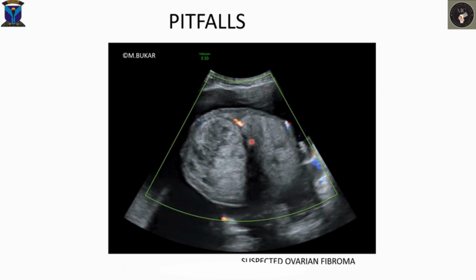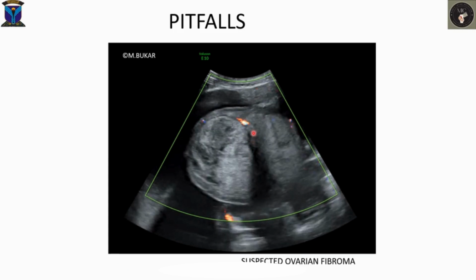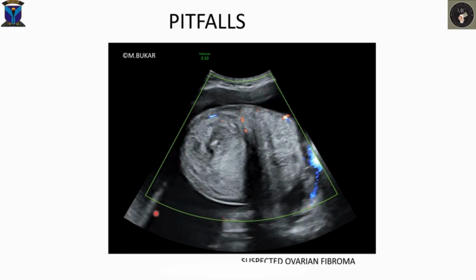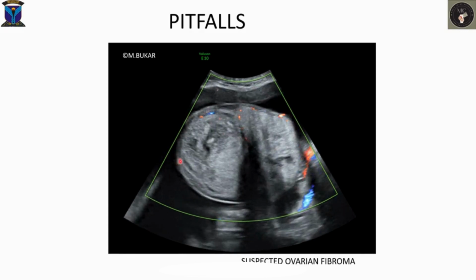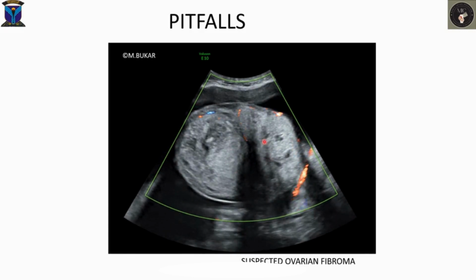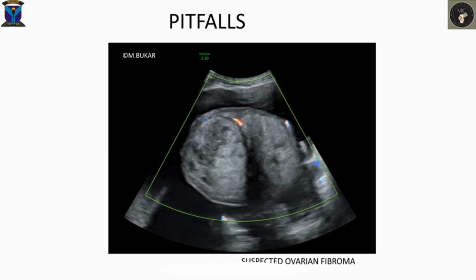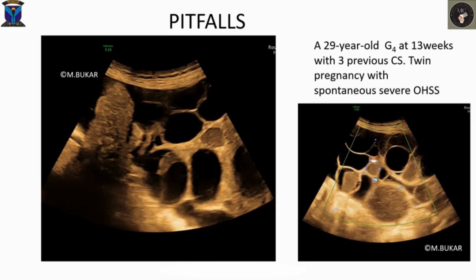Now, when we talk about acoustic shadows, again, we are making reference to the shadow that emanates from the substance of the lesion, not edge shadowing, but shadowing that emanates from the substance of the lesion.